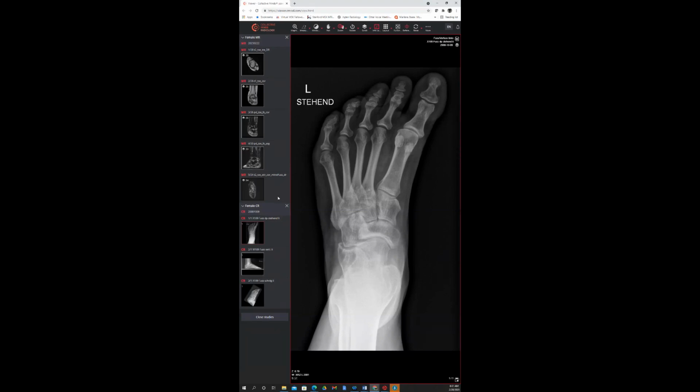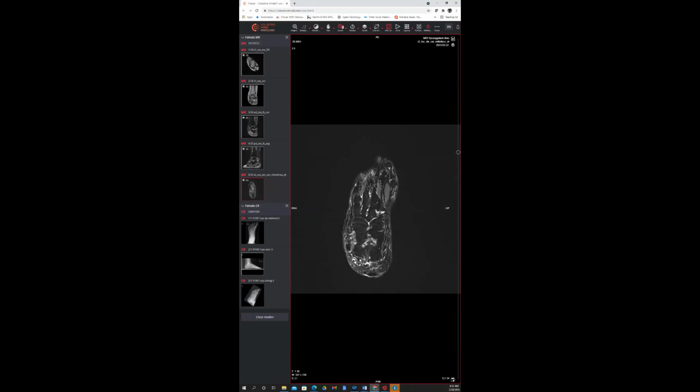And moving into the MRI, we can start to understand a little bit even more of the vector. If this is the fibula and this is the tibia and this is the vector of the leg, we can see that the talar axis is quite rotated relative to this vector. So just the mismatch between the tibia, fibula vector, and the talus gives us some idea of the biomechanical alterations in this foot. Also, we're seeing quite a bit of the calcaneus here.